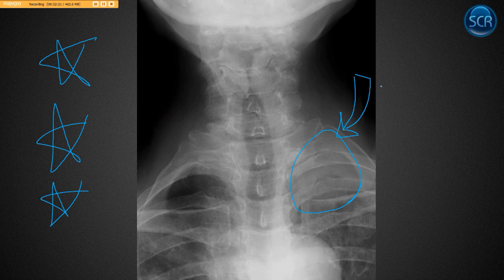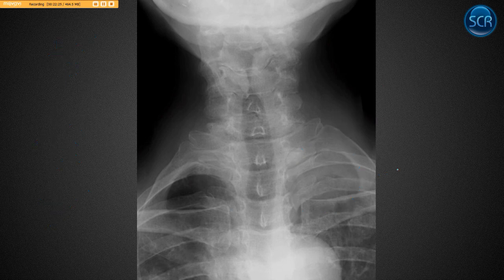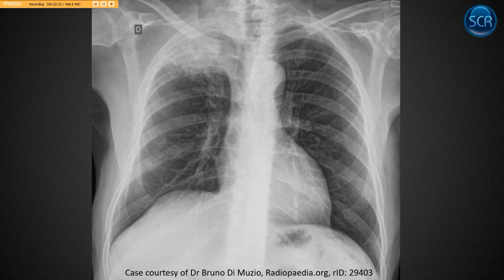All right. Look at the lung apices first on your frontal projections. Even on your chest, start in the lung apex. You don't want to miss stuff hiding up there, and then the lung hila are actually the other area. And we'll see some cases coming up. Oh, here's one right now. Okay, so this one is from Radiopaedia. Again, look at this lung apex. Normal, filled in. Okay, there's a lesion here.